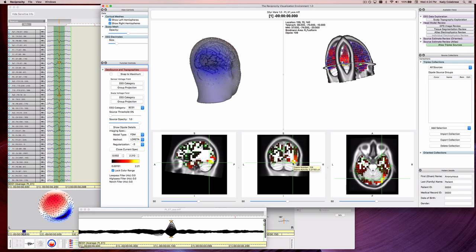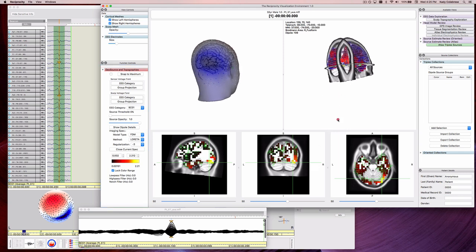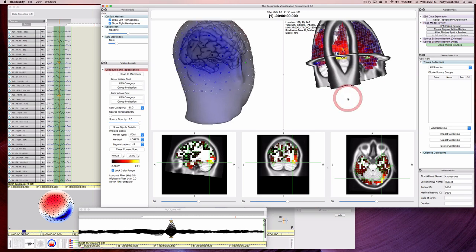Assess your results. The color within each voxel represents the level of current density at that point in time, yellow being the maximum current density. Values in source estimation represent the relative strength of a dipole required to reconstruct the scalp topography in question. Use the same controls as in the topography view to move the volume slice view around to view the results from different angles.